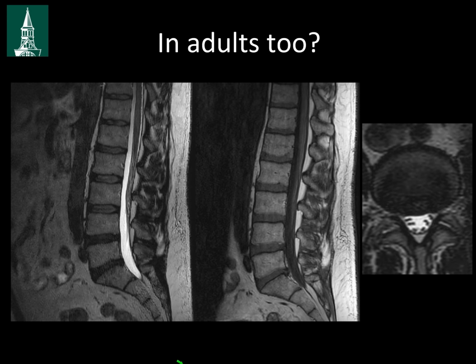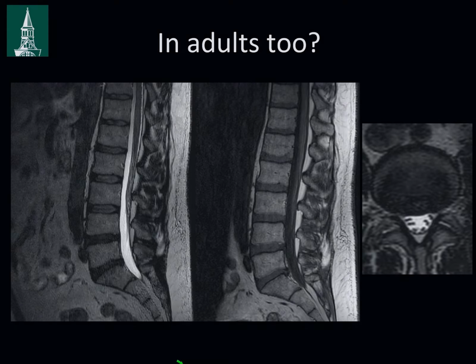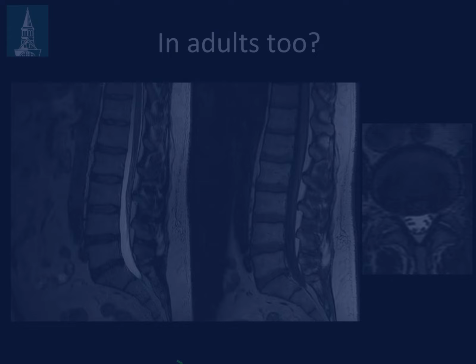Our neurosurgeons, for years, we've acquired cervical oblique images through the neural foramina. So that actually means we're usually acquiring 2 additional sequences in the cervical spine when we do our conventional imaging. If we do 3Ds, and we're working on this right now to really get it optimized, we don't have to acquire those anymore either. We can simply reconstruct in those oblique planes and not have to, and we can save another 10 minutes there on every cervical spine that we do. So the ability to do MPRs and reformatted images is really huge in 3D.